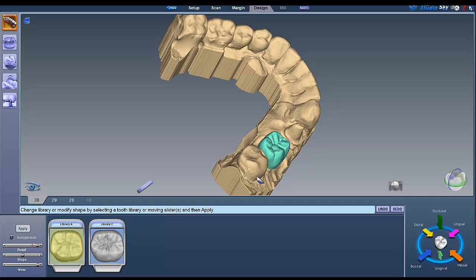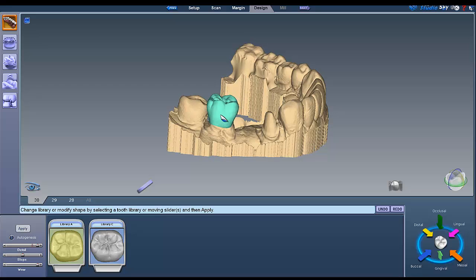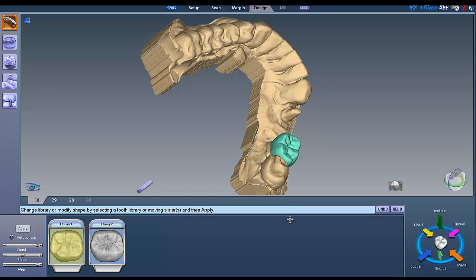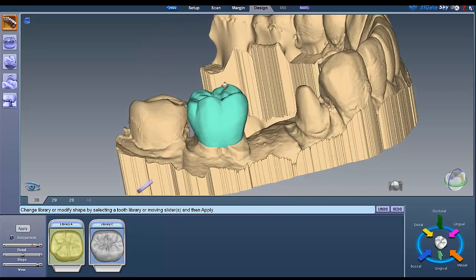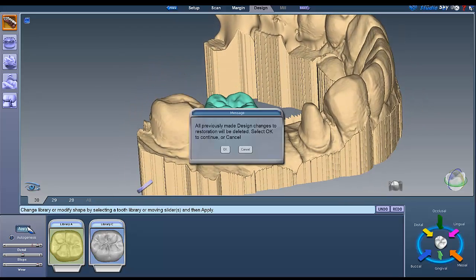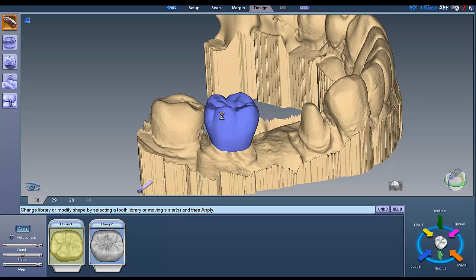And this, we could actually put this in and not use autogenesis, or we could use this trick and autogenesis together. I tend to do this resize, reposition, and autogenesis together, and typically that gives us a pretty good proposal. So that's what we've done there, is I've gotten that in position, resized it. Now we'll let autogenesis take over and bring our restoration into place. By resizing and positioning, we've kind of given the autogenesis a head start. It's now going to start figuring things out from the position we started with, and now we get a nice restoration.